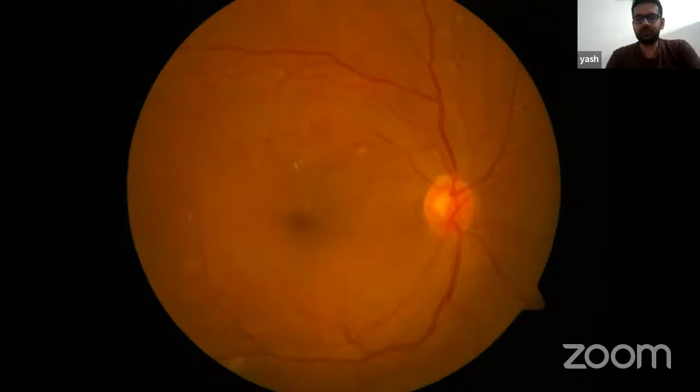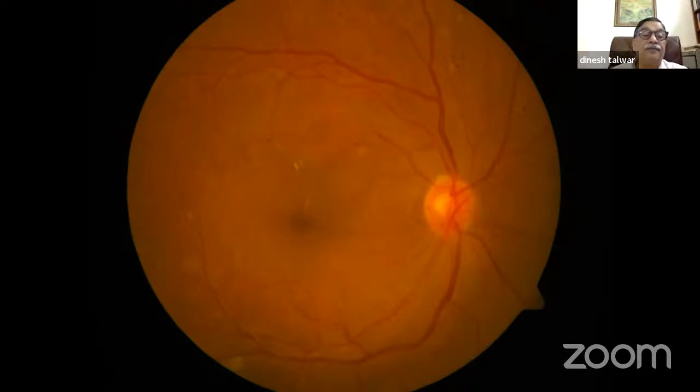No, sir. You see this area over here, this is hard exudate. If you look at this area, and above this there's a microaneurysm. And this whole area seems to have a little grayish appearance. Now, supposing this was draining into the macula, this whole area had edema up to the center. The leak was coming from here.